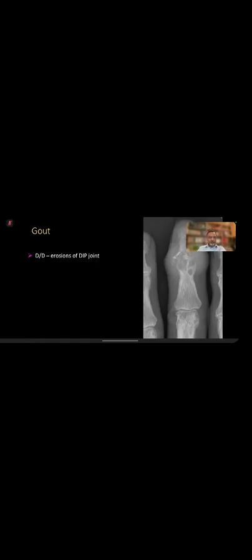So we have ruled out rheumatoid arthritis. So what else can you consider in the differential now? Gout is one. Sarcoid, yes. Septic is a possibility with the bone density like that. Let's stay on the things we mentioned before. Let's stay on the common things. Psoriasis, very good.